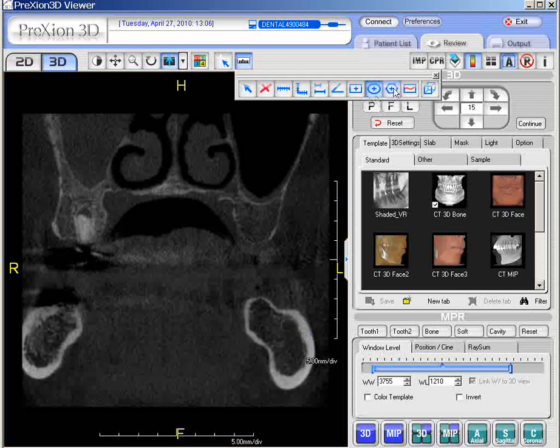This is the polygon. I like the polygon because you have the ability, it's like an Etch-A-Sketch, to trace it out according to the borders that you wish to select. It's more freehand. And now, again, back to the cancellous bone, you can see it has a wide deviation versus the other structures. So anyway, that is the real feature of using these three measurements, whether it's rectangle or ellipse or polygon.